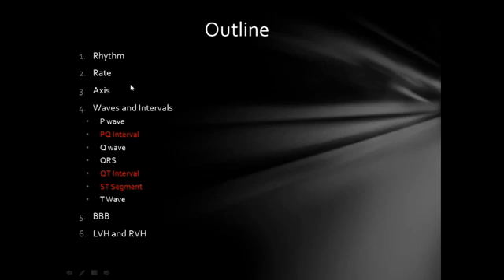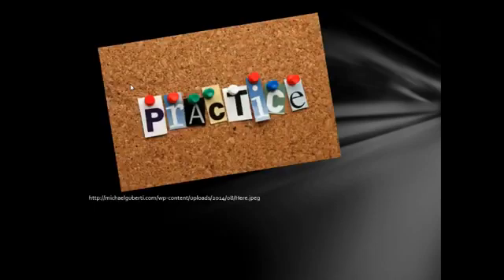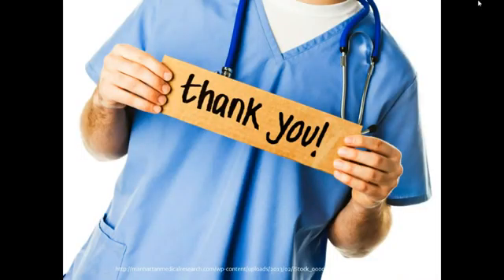So great, now we're done with all the steps to read an ECG. The best thing to do right now is practice. I would also recommend listening to this video again and again, more than once, so you can keep recollecting all the steps. And whenever you see an ECG, go through all the steps to make sure you do not miss any of them.